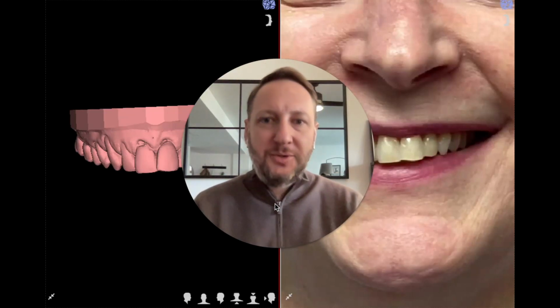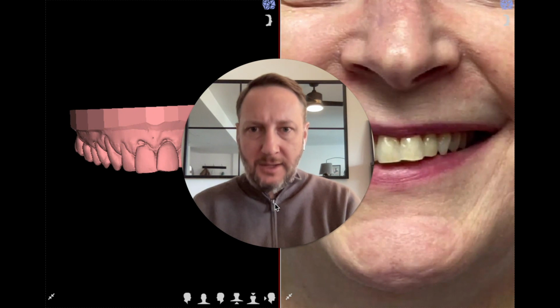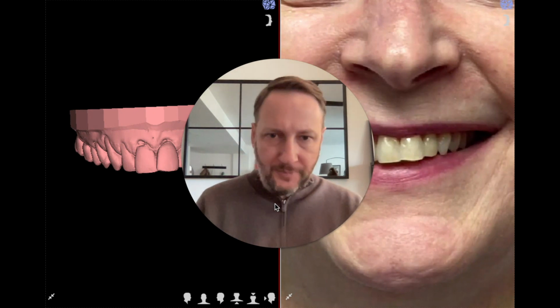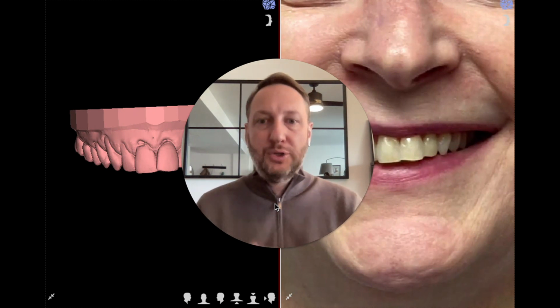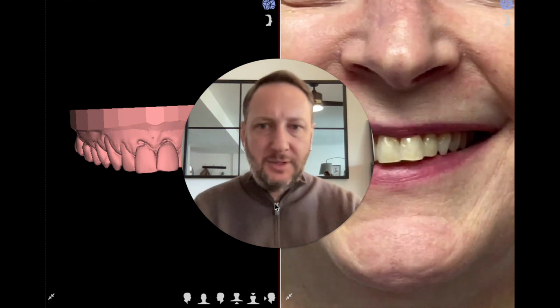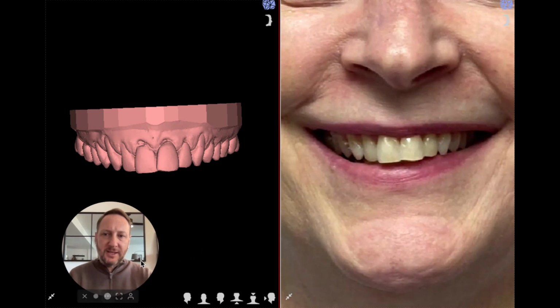Hello there. I would like to share one more interesting case, from the diagnosis, the creating of the digital smile design, to the planning of the aligners orthodontics, and then finishing with the post-ortho quality control where we can evaluate the outcome. Okay, let me put it a little bit smaller here. And here we can start evaluating our patient.